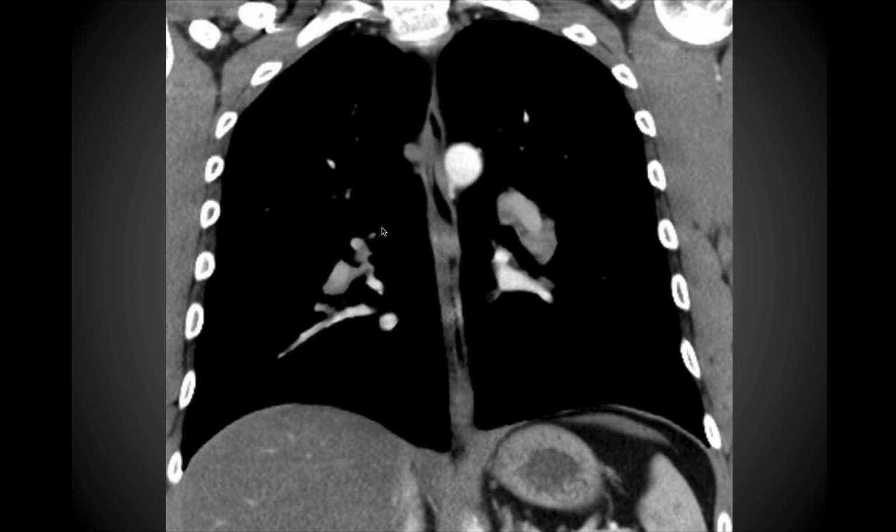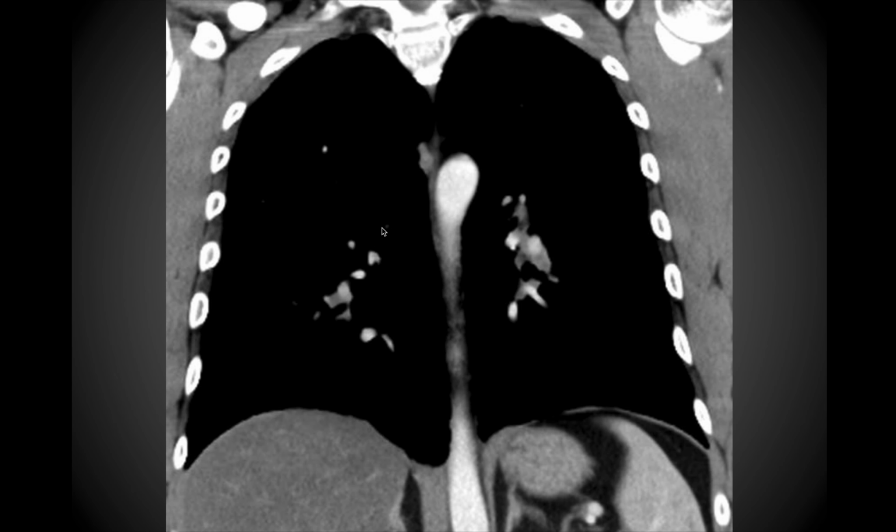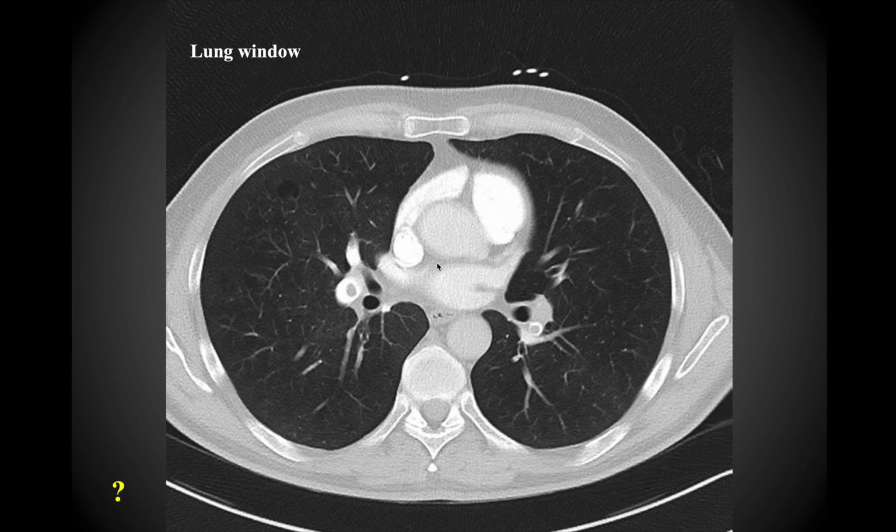And again, we'll just keep following these down. And then now looking at a lung window, this is another condition. So I want you to look through the scan, try to appreciate the normal anatomy, and make sure you can identify all the different structures that we've talked about previously, and then we're going to start going through some of these. So again, feel free to pause the video if you need a little bit more time to do your analysis. But where I want you to start on this one is start with what you know.